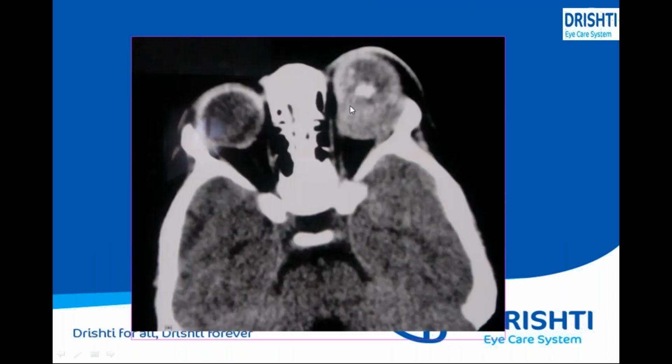Again, in these cases, if you see, this is the normal eyeball, and this is the one with the mass. This mass is not well identified. It is like an irregular, ill-defined mass. So the exact location and exact size of the mass cannot be seen in these cases. This is the normal eyeball, and this is the mass. All these white areas, if you see, you always need to compare this mass with the CSF. So this and this, the intensity is almost similar. So this is a solid mass. If it is darker, then that will be a cystic mass.